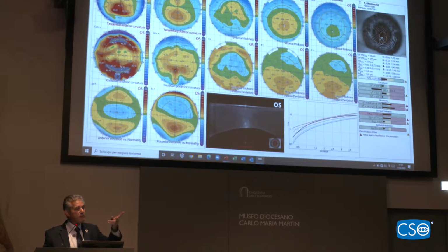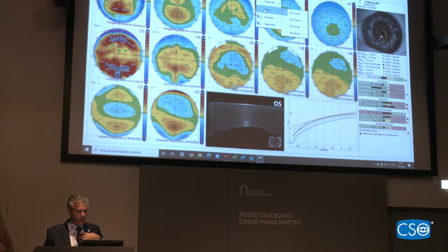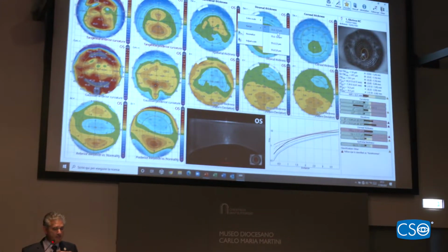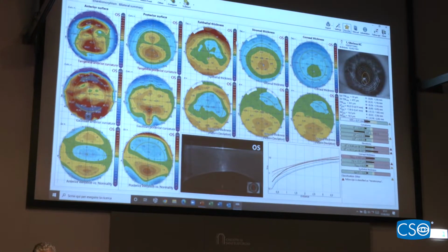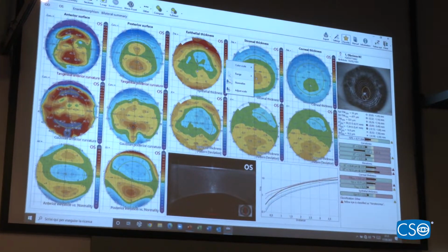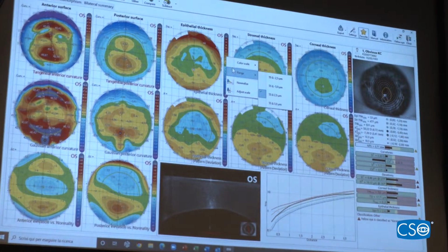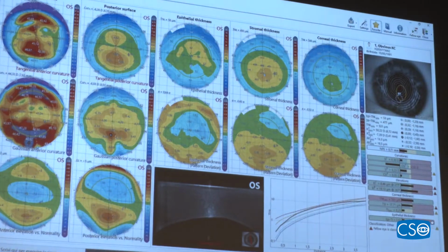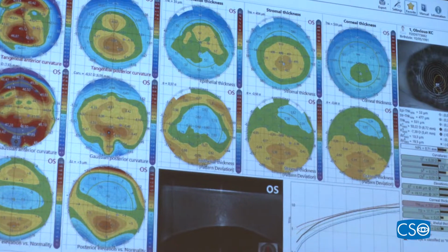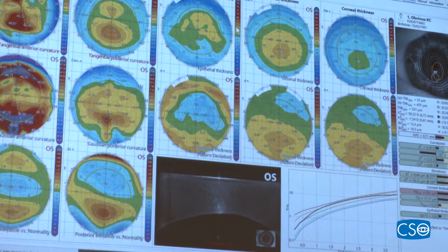And here we have a reverse; we look at this on a reversed scale. So our range is set to minus 2.5 microns. Many people say, why don't you put it the other way around so that when it's thinner, it's red? And the answer is, since 1991, when the first map of the epithelium was done, I decided to use opposite scales so that you don't confuse curvature with thickness when you're looking at maps. And also, you get used to it very quickly.